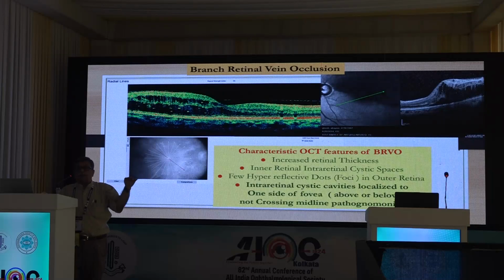So it doesn't cross the midline. So if you do a vertical scan and you find that the edema is on one side only, you know you are dealing with a BRVO. So you can actually make a diagnosis on OCT, and then you can treat the patient accordingly.